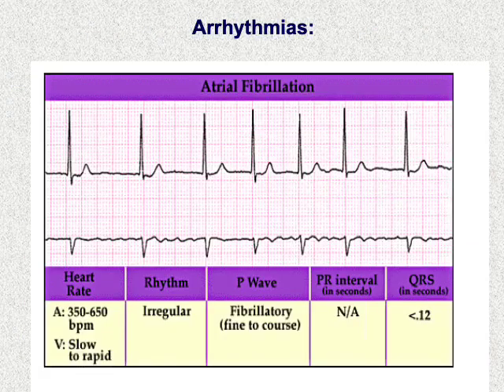The second item we'll review is atrial fibrillation. Atrial fibrillation occurs when there are multiple ectopic reentrant foci in the atrium, causing multiple firing of the atrium at a very rapid rate, usually exceeding 350 beats per minute. So not all will be conducted, and the AV node will protect the heart and conduct some of them.